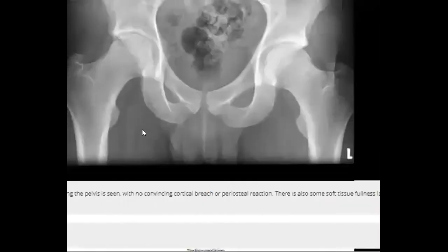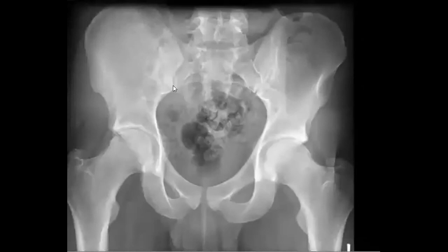So when you go back, I think now maybe you can see that there is something going on here, and even some soft tissue. Displacement of the colon is not easy to see. That's why I want to show you many cases of this Ewing. Sometimes it's very easy, but sometimes it's very tricky. Take care about this.